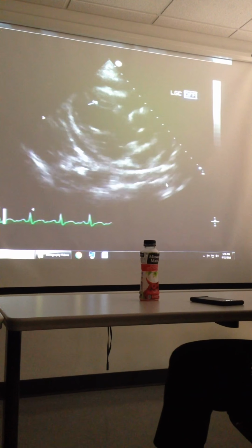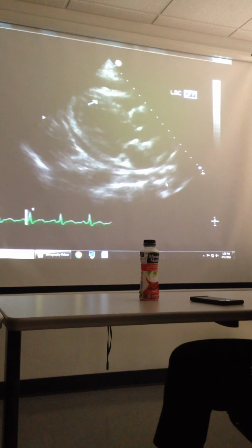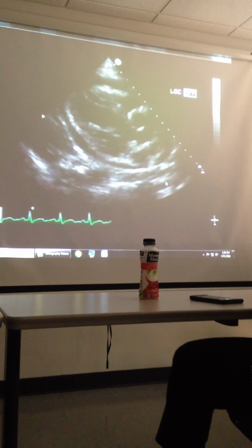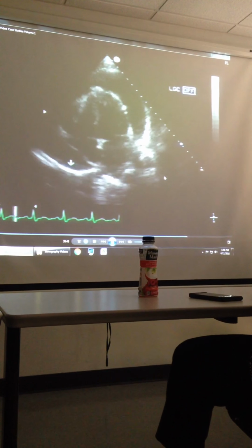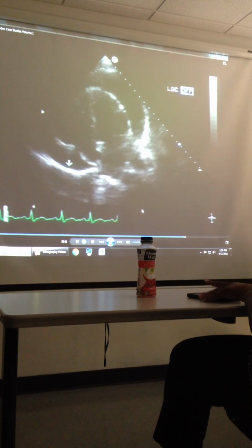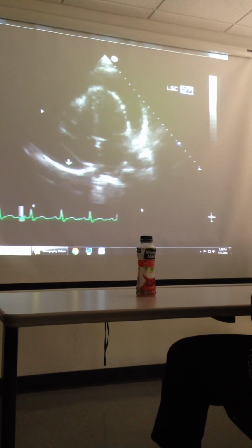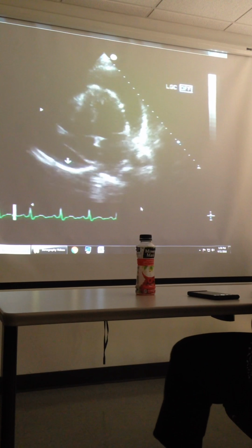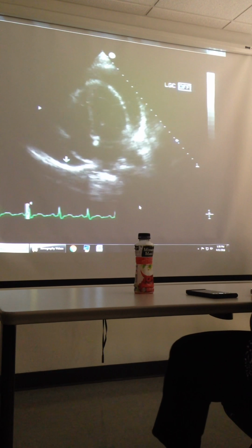Dressler syndrome. So in this parasternal long axis, you have an arrow, right? You see the arrow? We just saw it before. Okay, I'm gonna ask you what coronary artery feeds that wall later. And here you have an arrow, you see it? We're gonna try to figure out what this arrow is pointing to.